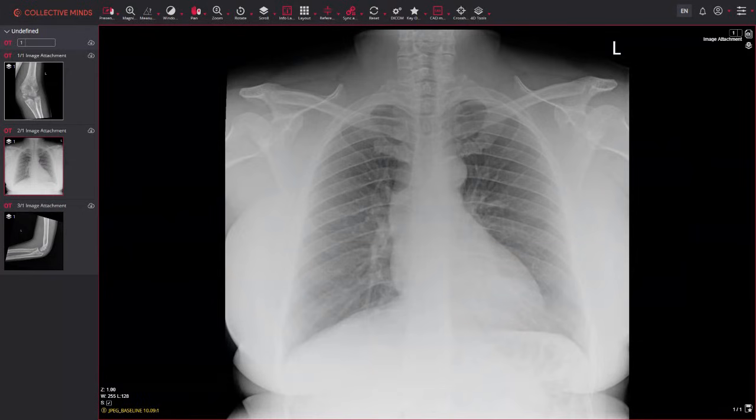So what have we done? We've done ID, we've looked at markers. Have we got enough images? Well, normally you would just do a PA chest. Sometimes we do laterals for pacemaker checks, but it's rare that we would do a lateral as standard these days. So unlike MSK, where we would have a minimum of 2, we usually just have 1 to go at.